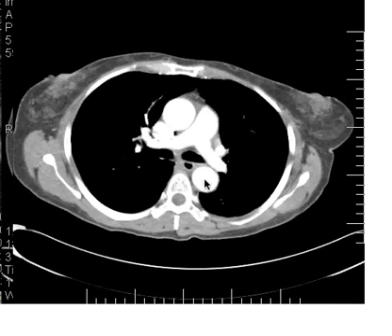Ascending aorta, descending aorta, and therefore we are below the aortic arch, and so here we have the main pulmonary artery branching into the right and the left main pulmonary artery. This, of course, is the SVC, and you can still see, even on this suboptimal image, a little of the mixing effect, some low density here, which is the mixing from the unopacified blood coming from the left arm. Okay, so main pulmonary artery, right main pulmonary artery, left main pulmonary artery.